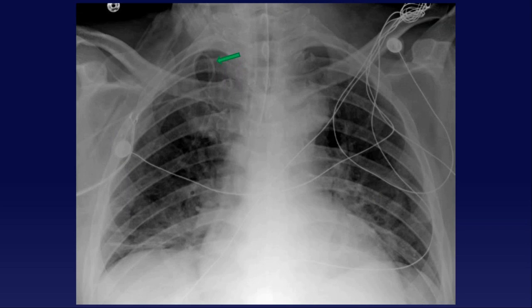Right here, I gave you guys the arrow here. Here the catheter is doing a loop-de-loop in the jugular vein, and the tip looks like it's probably in the high SVC. And so that's it for catheters here. So now I will just add one other thing that's helpful.